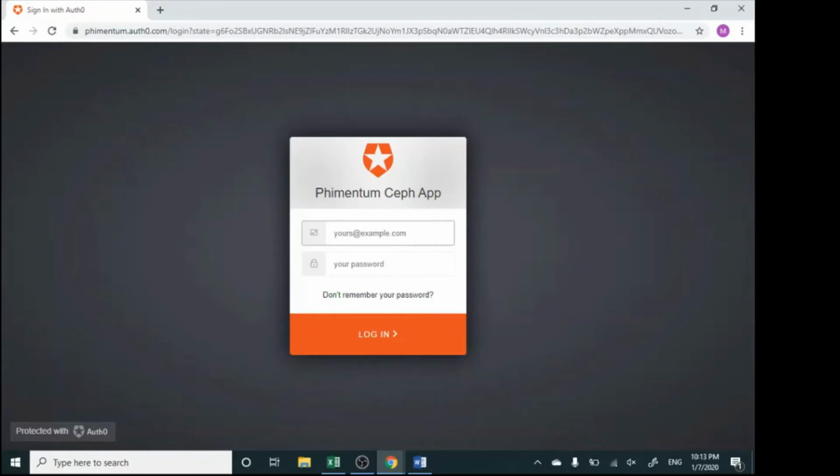As a beta tester, you received a welcome email that includes your clinic name and instructions to set or reset your passwords. Once the administrator of the clinic is given access to the system, he or she can add additional users by going to the account settings in the menu. Also, a second email you will receive will prompt you to create your own passwords.